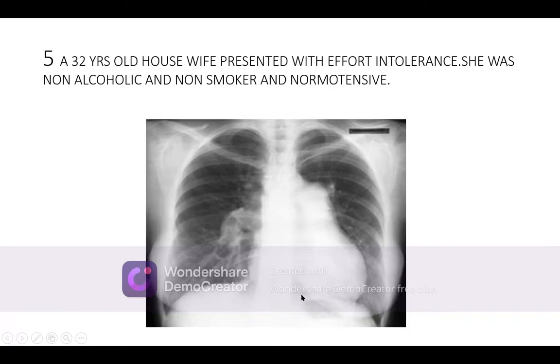But look, the lower part of the middle mediastinum is seen on the base. And this is the left border. It is protruding out and going up. The lower 1/3 represents the left ventricle. The upper 1/3 represents the left atrium. Here on the right border, the upper 1/3 is the superior vena cava, the inferior 1/3 is the inferior vena cava, and the remaining 2/3 of the right border represent the right atrium. The cardiothoracic ratio in this condition is slightly larger, definitely, if you calculate it.